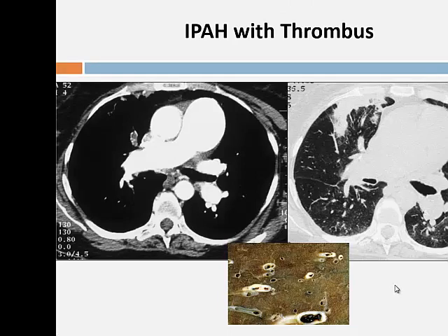You read the papers, they say measure the Hounsfield unit. If it's not in the center of the vessel, it's more likely to be chronic. If it's collateralized, if it's opened up, it's more likely to be chronic. All of these are rules of thumb. I don't think you can say 100% one way or the other. That's the problem. So often the safest thing to do is assume it's acute, anticoagulate, and then re-image. Okay?